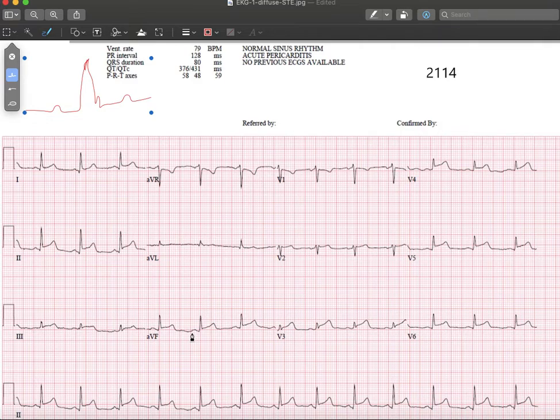In 99% of cases of inferior myocardial infarction, we observe ST segment depression in AVL. So why don't we have any ST segment depression in this case? AVL is considered a high lateral lead, which is also affected by the injury in the lateral wall, as well as the reciprocal changes from the inferior leads, especially 3. So these competing forces between the ST segment elevation and the reciprocal ST depression bring the ST segment to baseline.